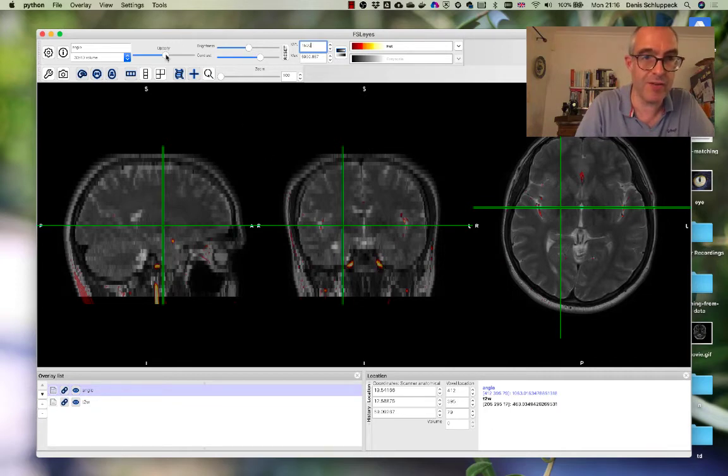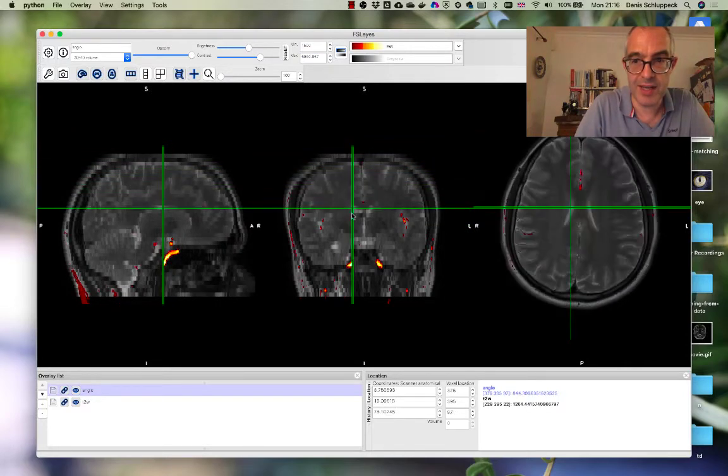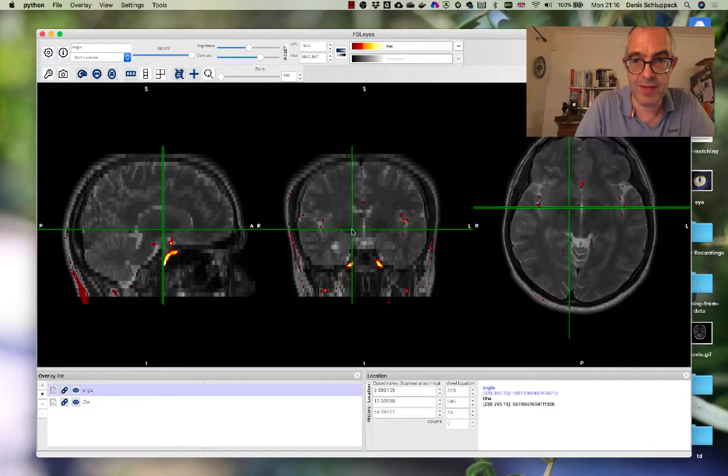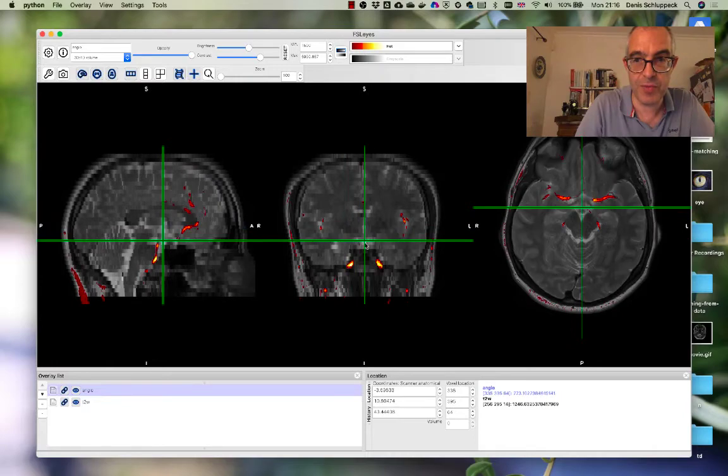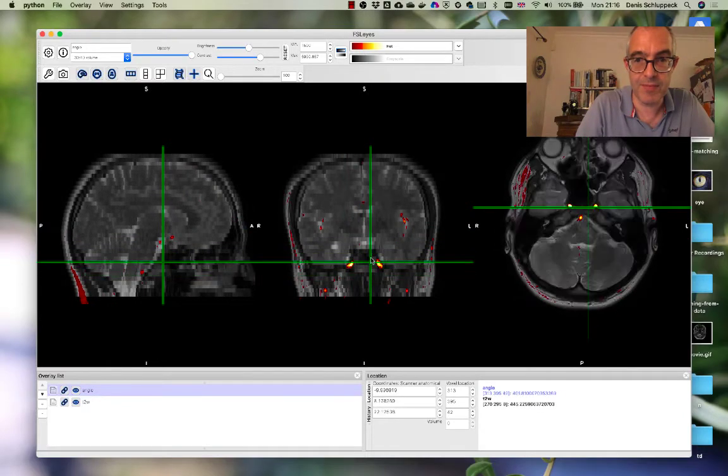They're actually a bit hard to see, so let me now turn the opacity up from 50 to 100. And if I scrub the images down, you can see this very particular pattern of the blood vessels as we're traveling from top to bottom on these images, okay?